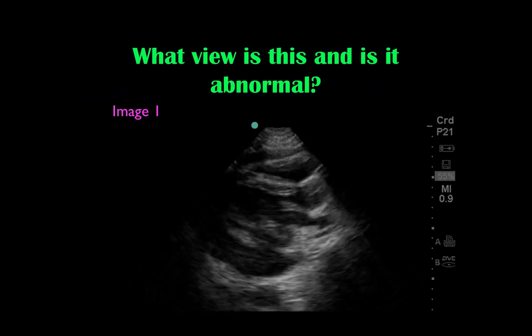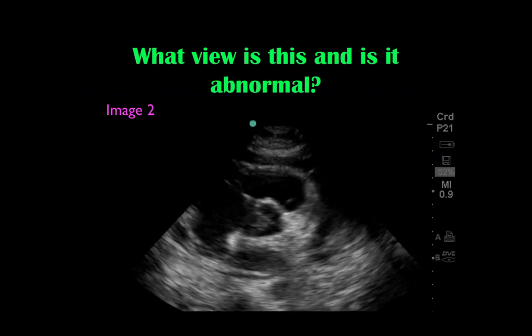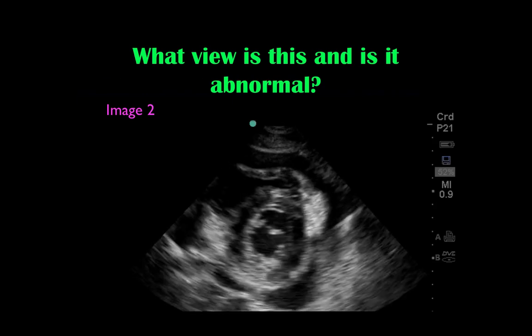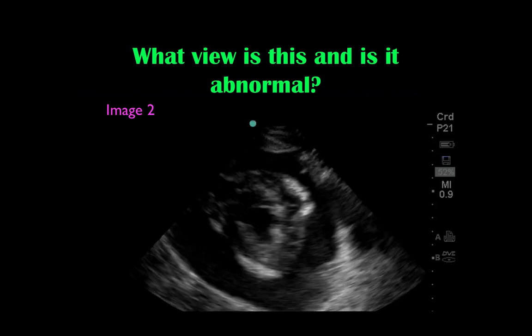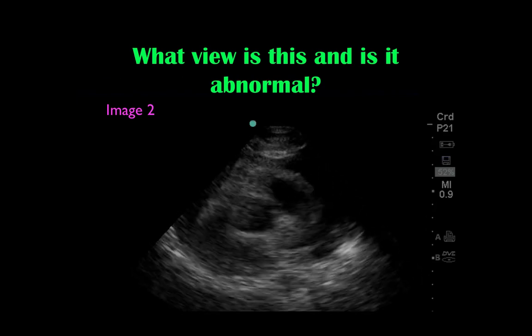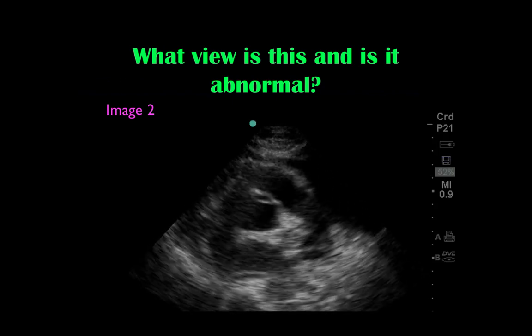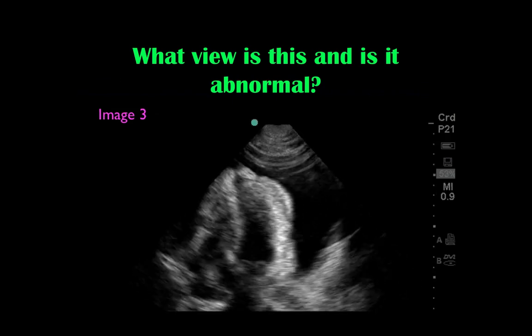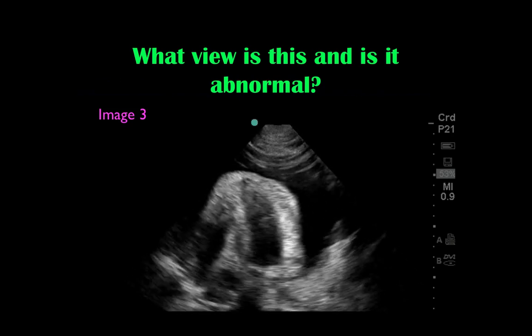Now let's take a closer look here. Image number 2. What view is it, and any abnormality once again? And once again, we'll take a closer look at the heart by having additional imaging. Here's image number 3. What view is this, and is there any abnormality?